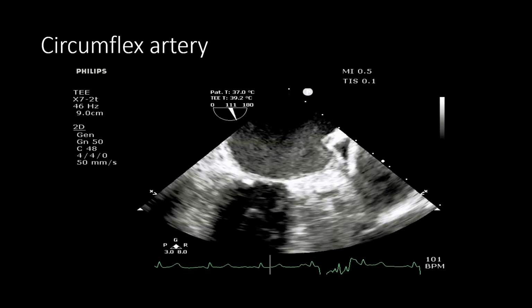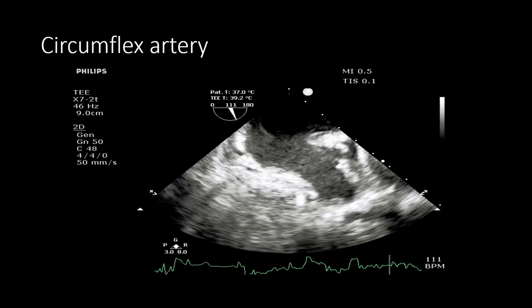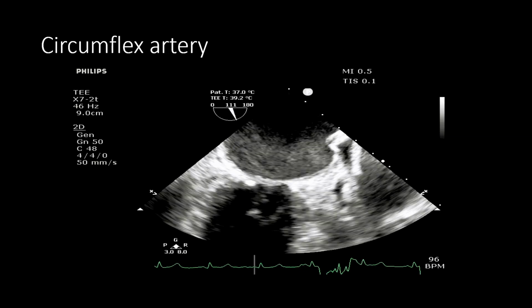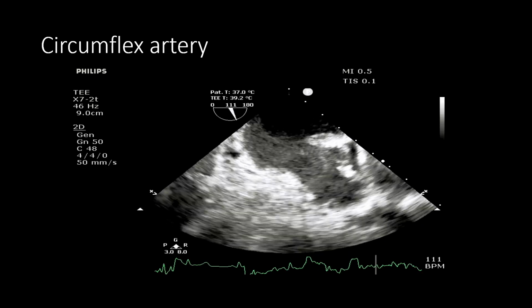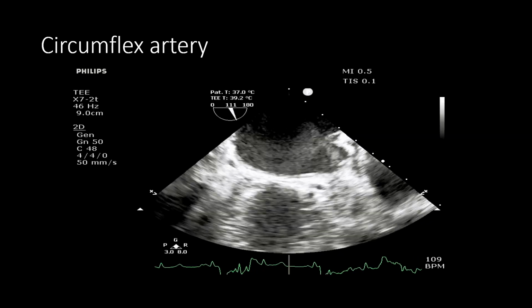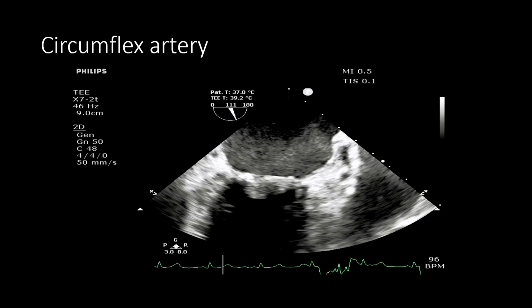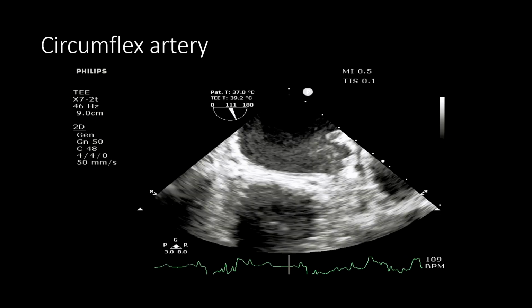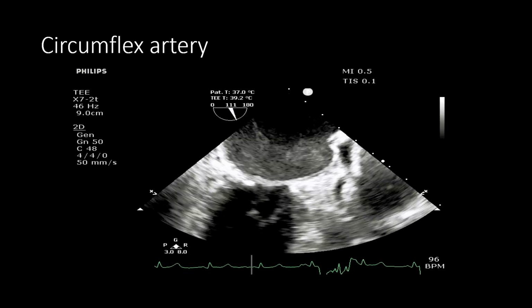The other thing you have to see in a mitral case is examination of the aortic valve, especially if there is any pre-existing AR or not. Because there is always a chance that the non-coronary leaflet of the aortic valve sometimes gets taken by the surgeon during the repair or replacement, and it can cause AR. And if you don't know whether there was AR before, then it becomes difficult to comment on that. So that ends the discussion for mitral regurgitation.